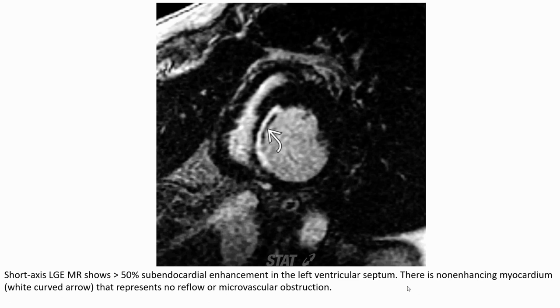The short axis late gadolinium enhancement also shows more than 50% subendocardial enhancement in the left ventricular septum. There is non-enhancing myocardium, curved arrow, that represents no reflow or microvascular obstruction.